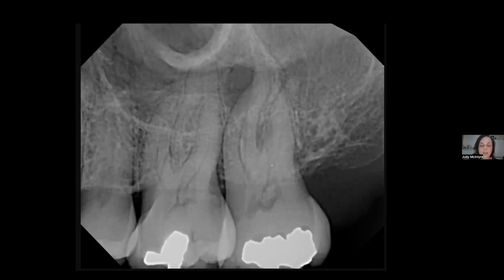Here you can see a periapical image, and I always like to look at the crowns first. So we have some medium-sized restorations, nothing very impressive for sure, maybe some recurrent decay, some pulp stones, and I always also like to follow the horizontal bone levels. And while this looks quite contiguous and quite even horizontally, I want to say that really it looks less dense horizontally here, a little bit. And of course, there's a periapical lucency in this upper left second molar.